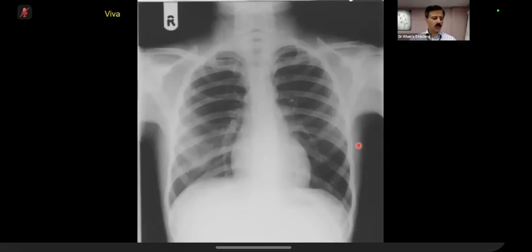Your conclusion, what is your conclusion? So I'm concerned about the chest wall lesion, a soft tissue sarcoma of the chest wall. Be my two top differentials. What is the age of this patient? So the epiphyses appear to be closed. They don't have much degenerative change. Probably a middle age. Look at this one.